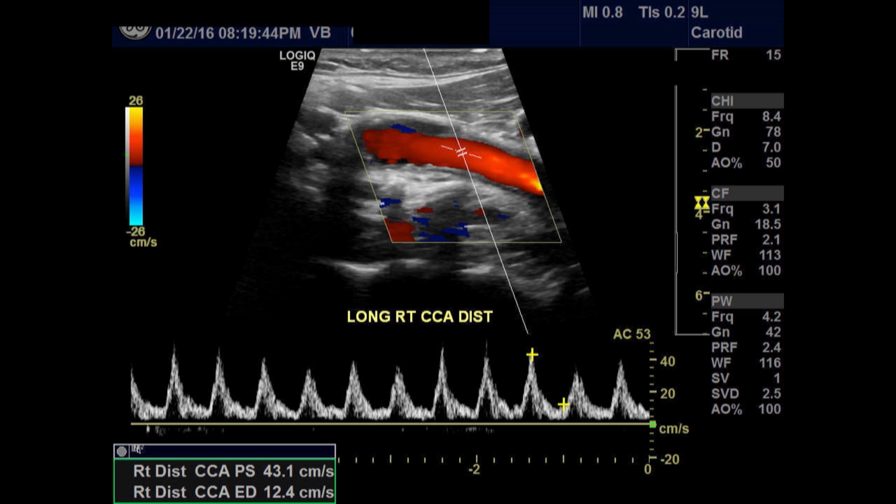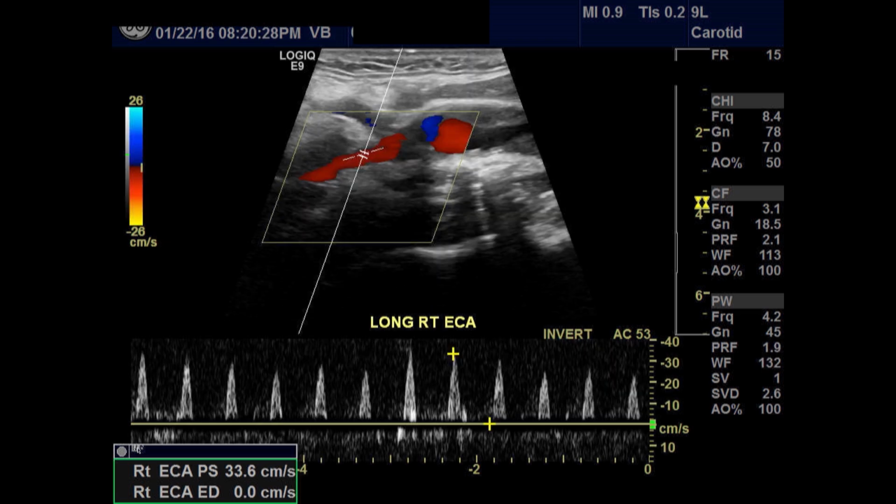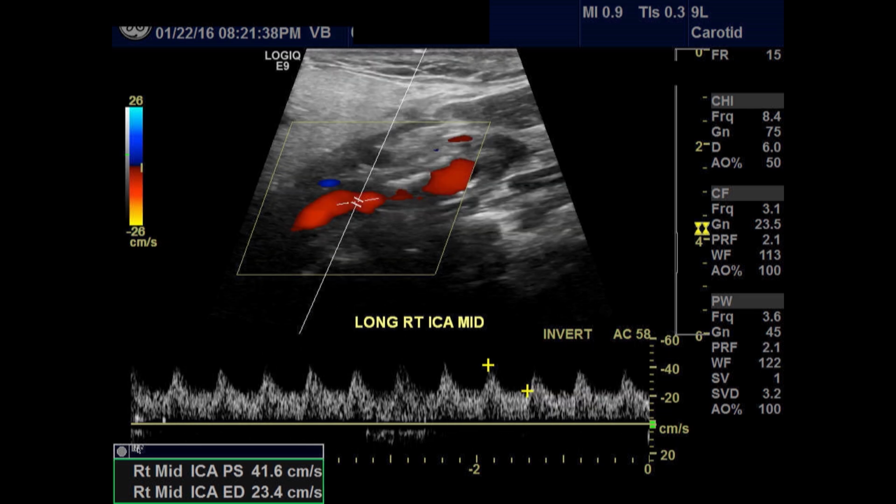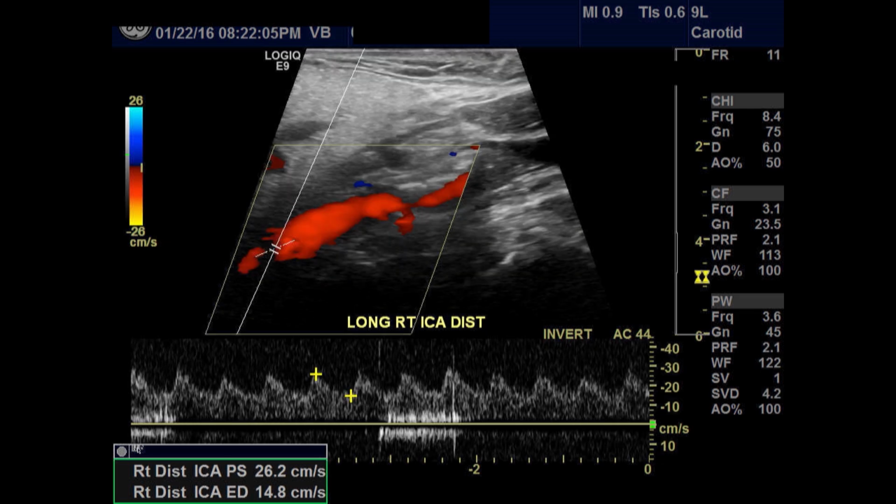And with this dissection, or almost look like an acute occlusion proximal, you're still able to have some flow coming up and able to supply both ECA and ICA. So red going away and going towards the head, and again the red here for the ICA going towards the head. So again, the sequence of these measurements were not synced, because it's an unusual study and unusual finding, but at the end we have all the measurement done.